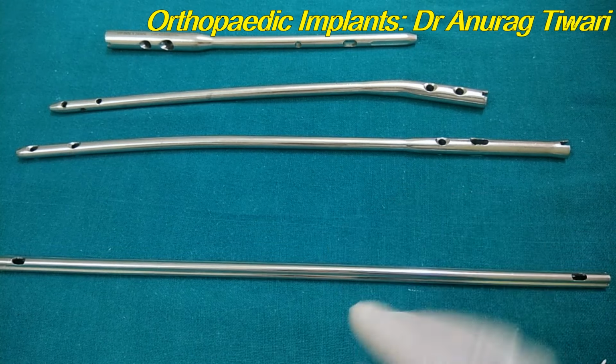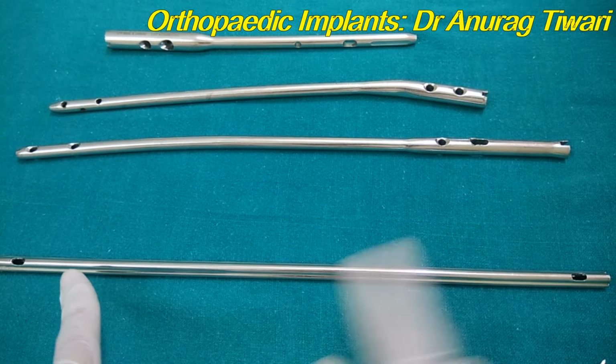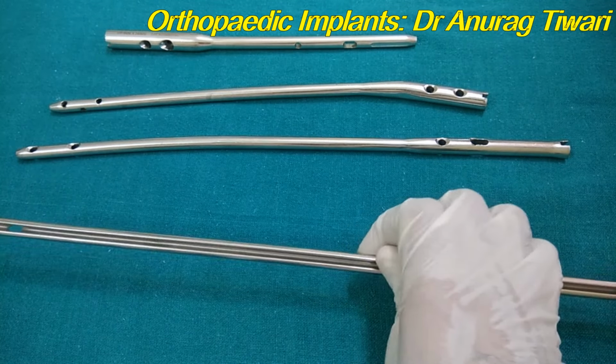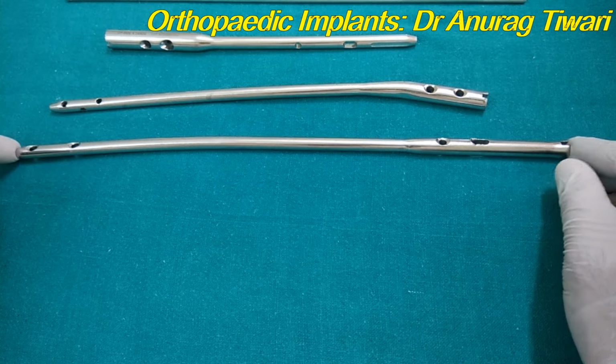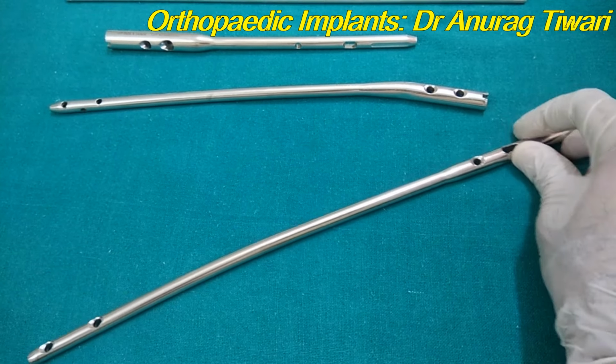So this is all about the K nail. Just remember the 3-point fixation, the slot, the eye, why two eyes, and how to increase the size of the nail. But the main disadvantage of the K nail is that it doesn't provide any rotational stability. So to provide rotational stability, the interlocking nails came into the market.